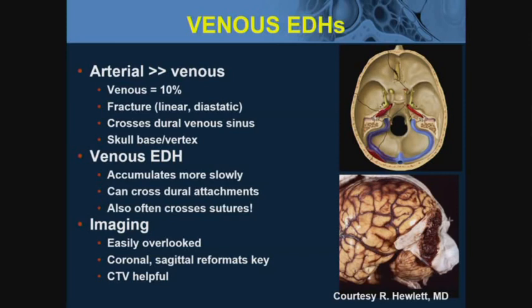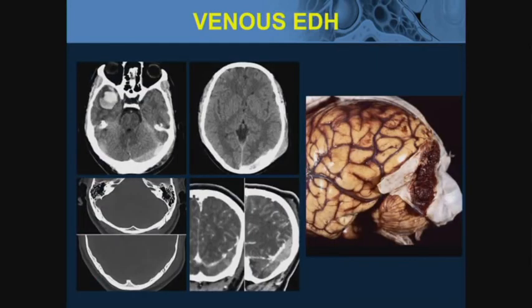So if you remember people saying, no, epidural hematomas don't cross, beware, indeed they do. Venous epidurals are easily overlooked. Our reformatted scans are absolutely key to the diagnosis, and CTA or CTV are very helpful.